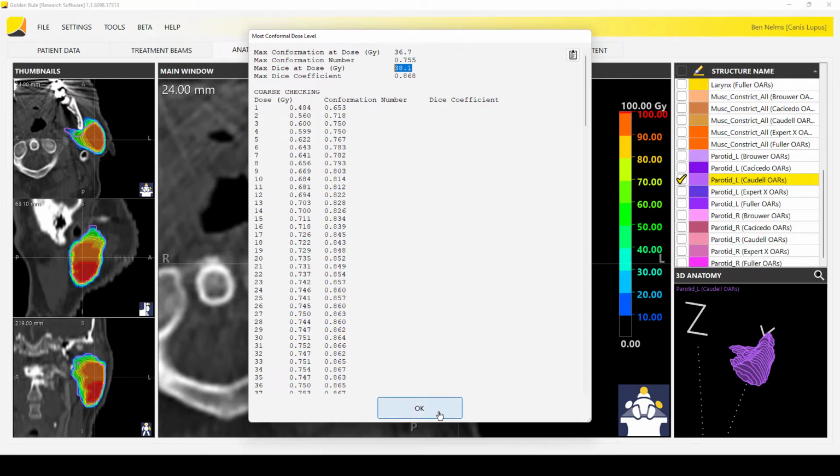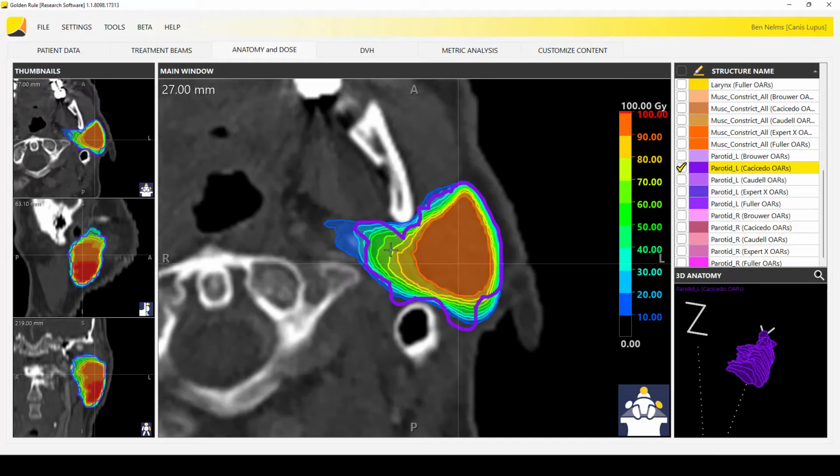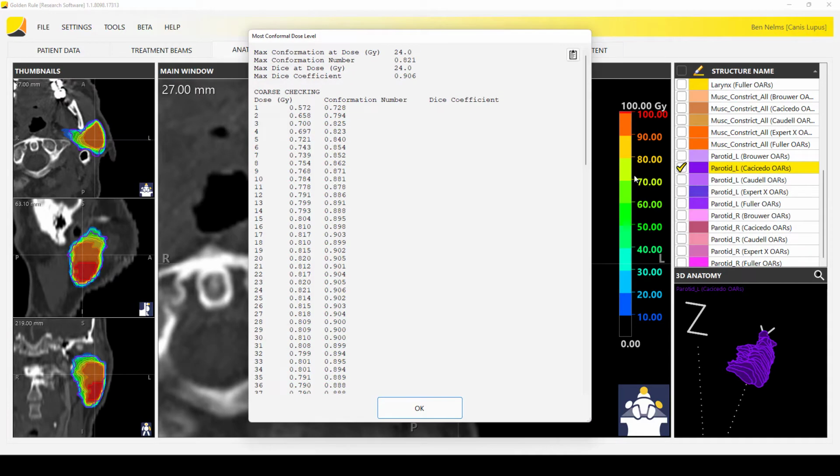Just for kicks here, let's pick John. John was one of the experts. Now this is interesting. So he didn't have that, he differs from Jimmy a little bit there in some of that structure. This starts to look more like, I don't know, maybe the 20-30% line. Let's see what level of agreement we have with this expert. Okay, it's higher. It's at 24% of the population. So people who are drawing it larger are looking more like the experts so far. And a DICE of 0.906.